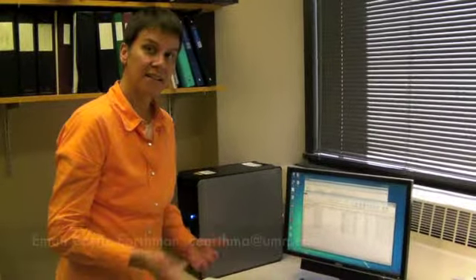That's fairly simple. I realize there are a couple of steps to it, but once you do it once, you'll see that it's fairly easy. There are a couple of things that need to happen before you send that. So the hope is that you'll send those files to me maybe on a weekly basis so that we can get the data every week and deal with it from there.